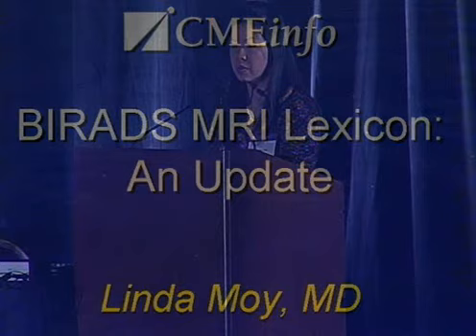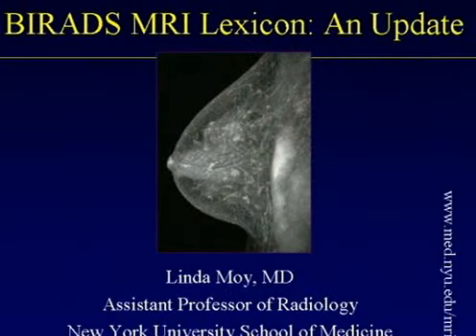To start this lecture, we're going to talk about the BI-RADS Lexicon. I'm going to describe to you all these descriptor terms, and we're really going to focus on telling you my experience of using these terms. As an update, I'll show you images that we've been performing on the 3 Tesla, and finally we'll show you lots of images so you get to see what these descriptor terms are about.